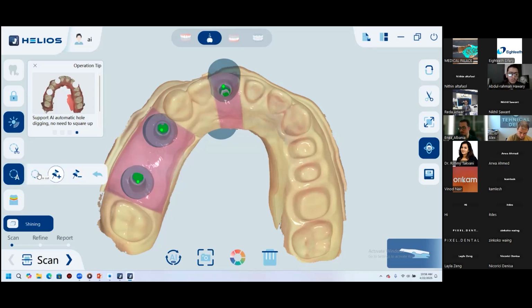And we also made the icons to edit available. So the AI is not to eliminate the operator. The AI is available to help you out and reduce your hassle and your time. Okay, I see. Thank you. And my second question is, can you show us the workflow for denture scanning? Let's say, is it possible to scan with the triple tray for the bite scan?